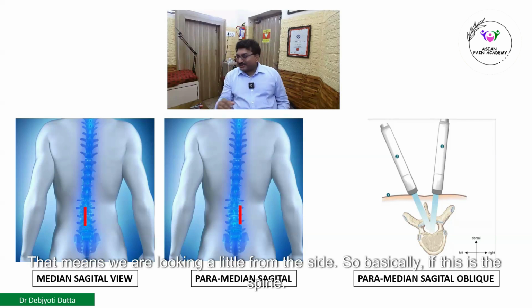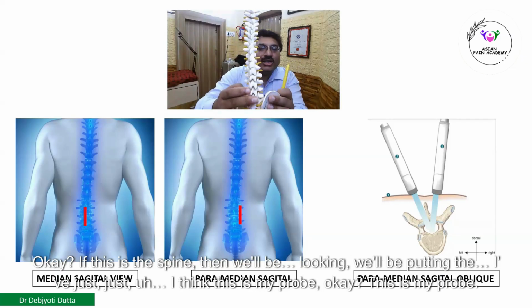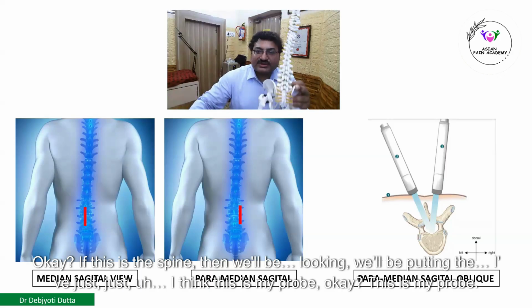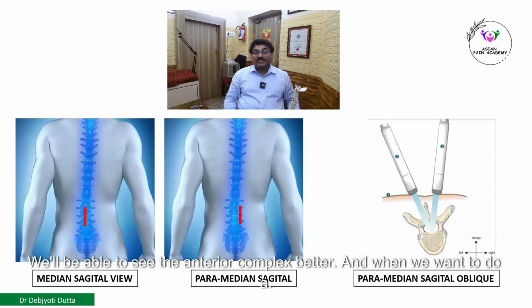So basically, if this is the spine, then we'll be putting the probe, think this is my probe. When we are scanning from the midline, it will be like this. And when we are making it slightly oblique from this side, what will happen? We'll be able to see the anterior complex better.